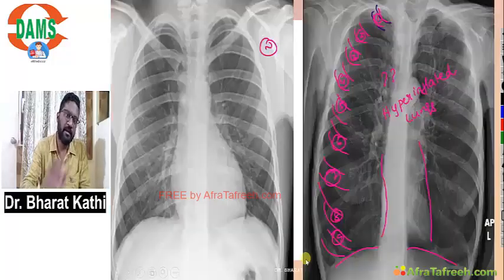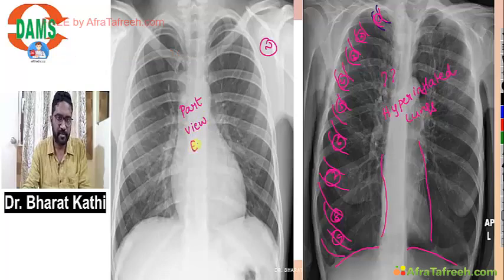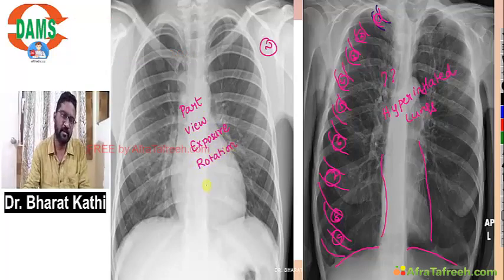Then, now is it okay? Are you all confident regarding the part, the view, exposure or penetration, then rotation, then inspiratory effort?